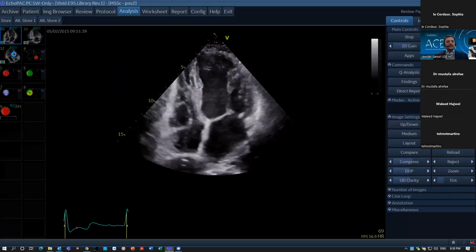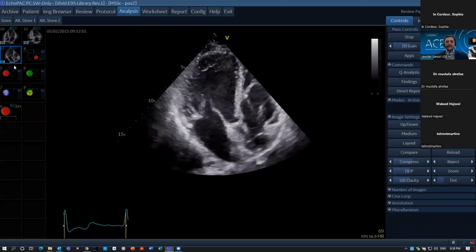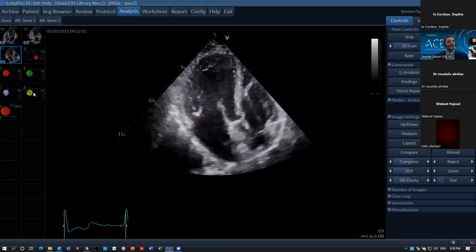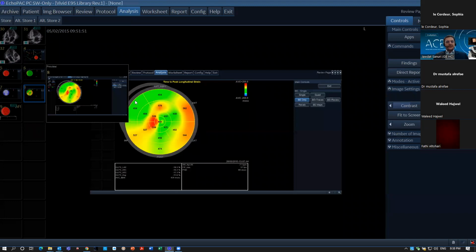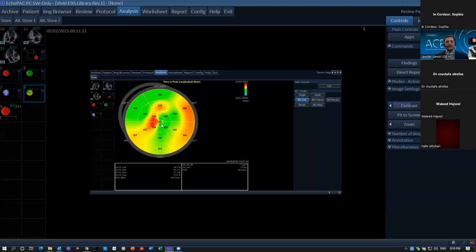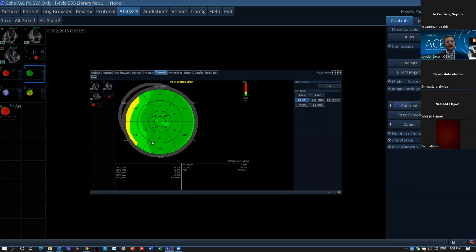So this is a nice study for AFI. I think this is a pacemaker patient, and I don't know if it's during adjustments or pre-post pacemaker, but you can see here the time to peak strain. Here it's 430, here it's 540. The peak strain dispersion is 69 milliseconds. So you can see there's asynchrony going on during the time of adjustment, while here these are the strain values.